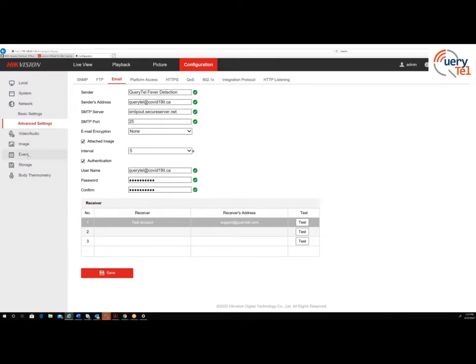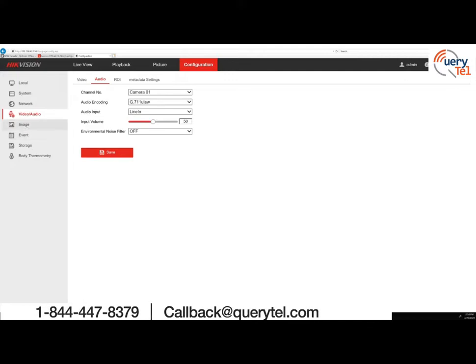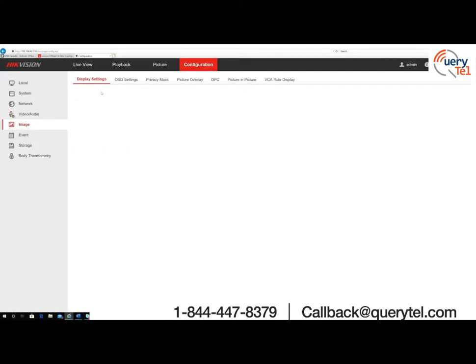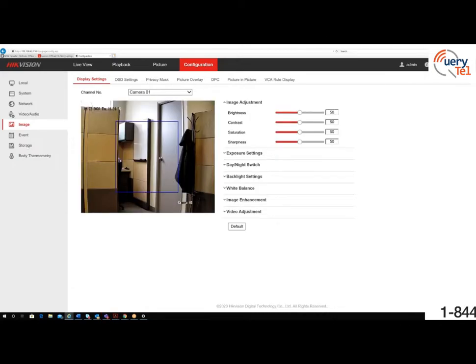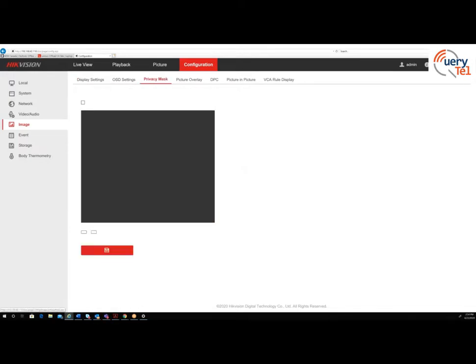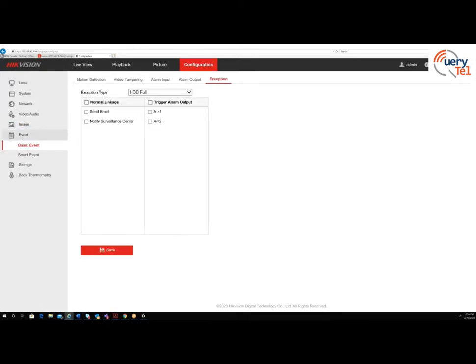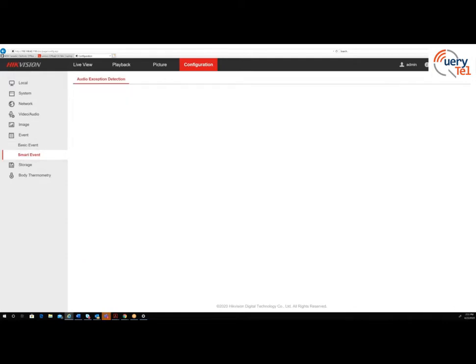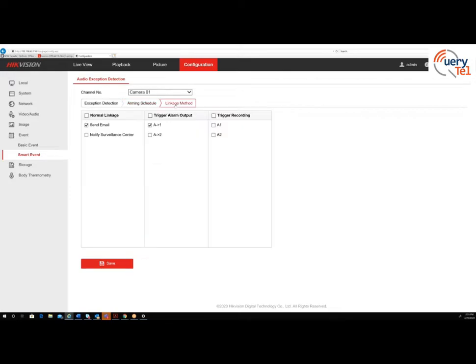So here's the thing. Under video and audio, one second, page, everything is left at default. You don't have to touch any of that. We can do a privacy mask if needed, but I didn't do anything. I'm quickly going to show what I've done here. So we are not doing a basic event. We are doing a smart event. So a smart event, linkage method, send email.